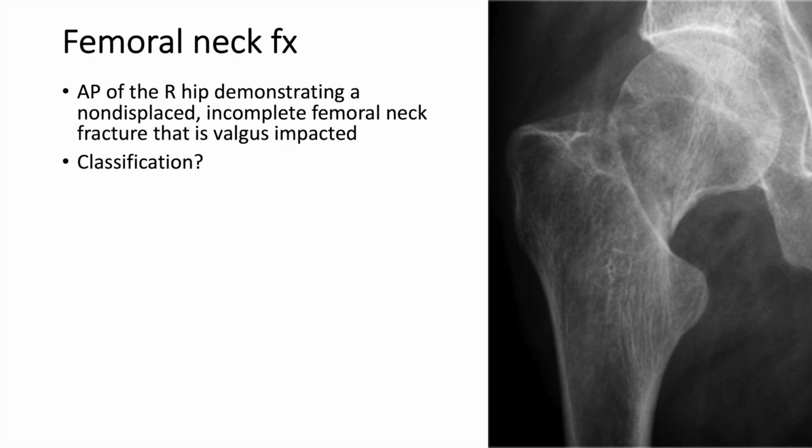Let's go over the classification. So this is a Garden classification, all right? And so the Garden type is going to be Garden type 1, all right? Because I said the magic words, valgus impacted, right?